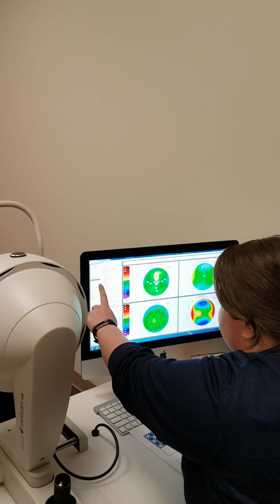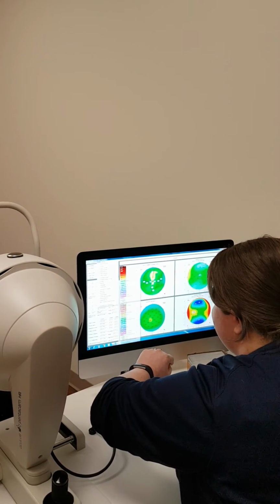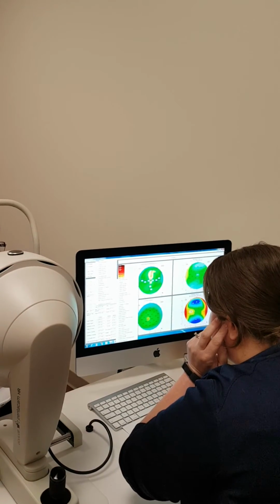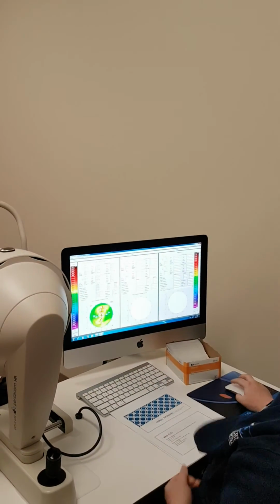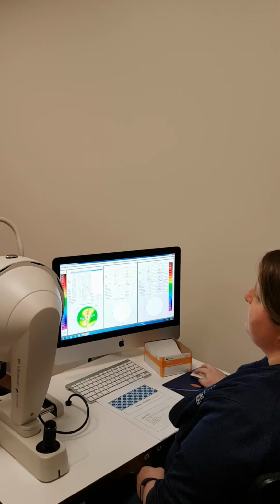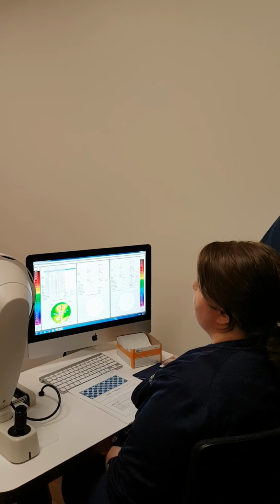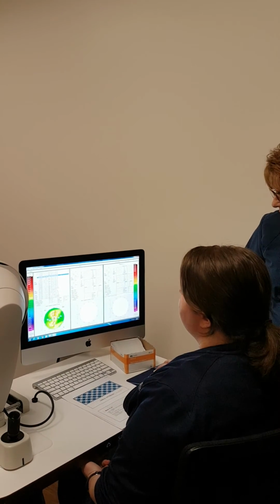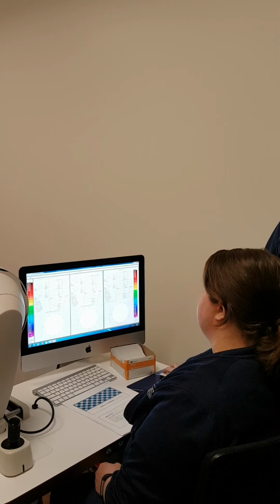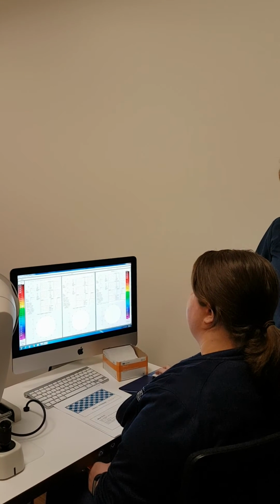If you go here, now I've only found this one. Here we go. Show compared exams will give us that information. And you can select which Pentacam of the million you want to have as your A. So if I go back and I say, okay, the date from 11/15, I want to look at that test versus, maybe, it takes a minute to load.